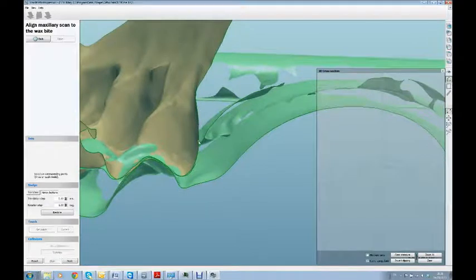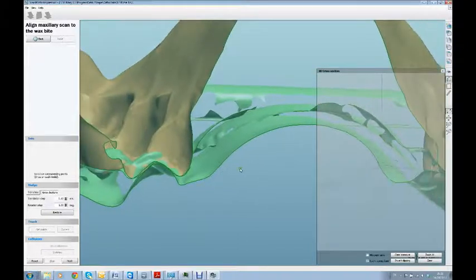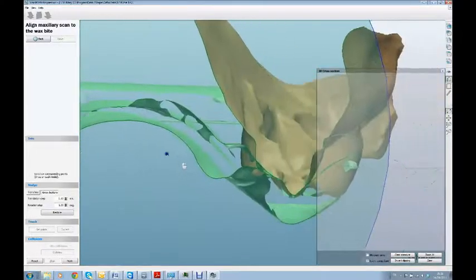Here we can make out the outline of the profile of the tooth, and then we also get to see the profile of the bite registration. Now there will be some distortion. It's inevitable. You know, it's not possible for us to have an undistorted bite registration.